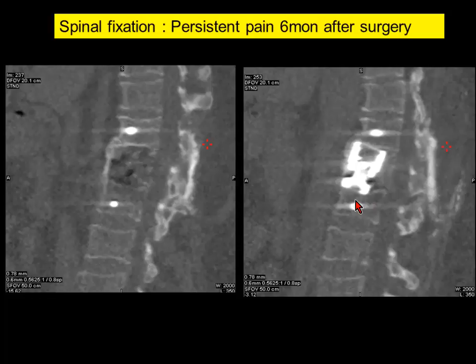On this, if you're looking at the spine, you need to look at whether there is fixation, whether there is any calcification between the joints. So you see this, there is anterior osteophytosis and there is fusion, anterior bridging. So these are the bridging. But there is some air within the disc, the vertebra is gone, so they have put the mesh here. But you don't know why and what's happening.